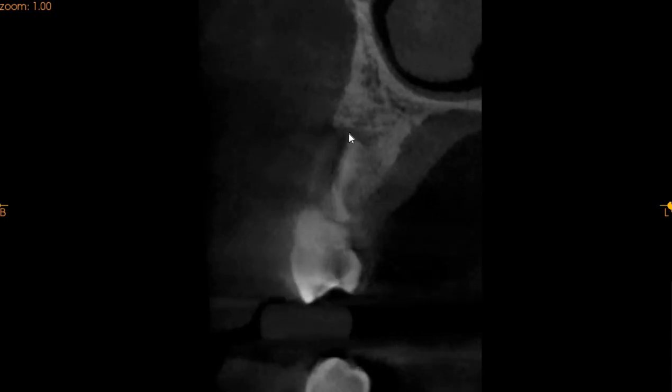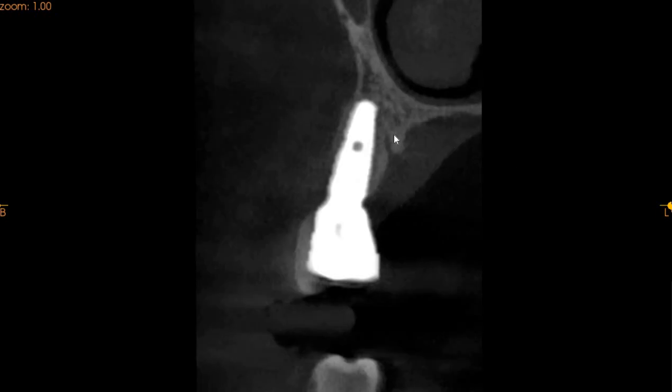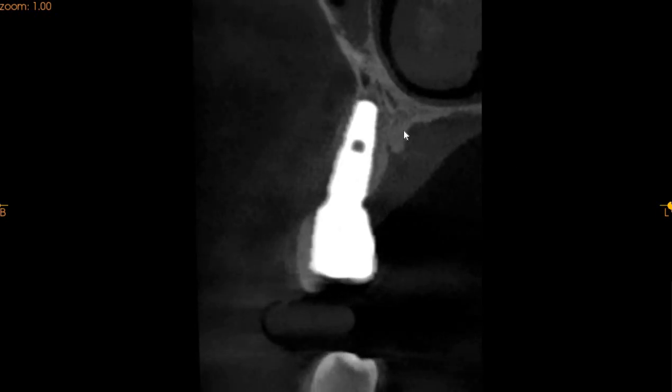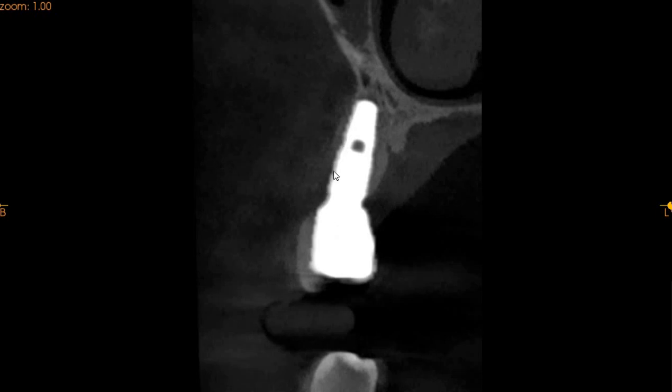Moving to the distal aspect, we can see that there is significant bone loss associated and a periodontal lesion in the interdental spaces between the 4 and the 5. We've got loss of the buccal cortical plate. Now moving to the implant surface. On the implant surface, we can clearly see that this is the implant. The implant is placed slightly buccally but doing generally well. We don't see any periapical pathologies or pathologies on the palatal aspect, but we do see buccal bone loss. The threads can be seen visible here. We can also see that on the mesial aspect, there is a radiolucency associated with the implant.